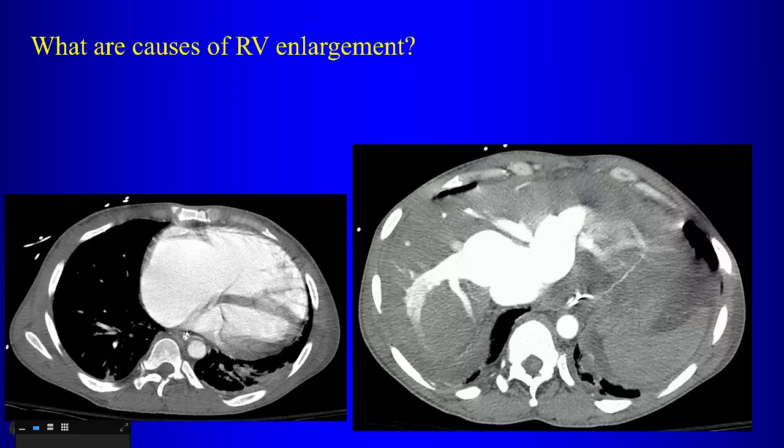I haven't shown you the pulmonary arteries. Well, the parts that you can see. You want to look at the central pulmonary arteries. But from what I'm showing you, how do you know this patient doesn't have pulmonary artery hypertension? Or at least chronic pulmonary hypertension? Well, what's the status of the right ventricular myocardium? It's not hypertrophied, right? So this patient doesn't have chronic pulmonary hypertension.